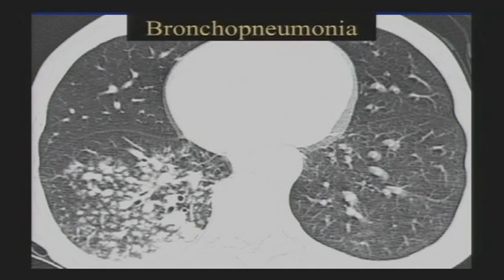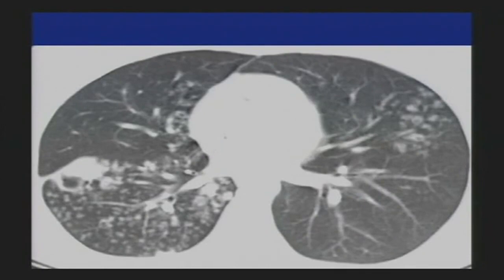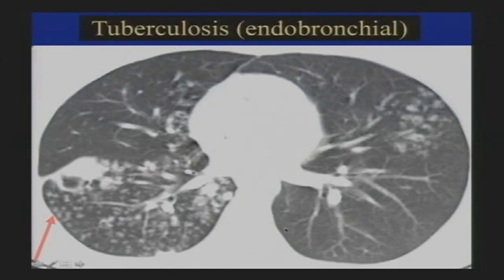Okay, another example. A nice example of central lobular nodules. See how they spare the subpleural surfaces? Eventually, when these nodules get big, they're going to touch the pleura, but the centers of them are always away from the pleura. You can see this is another area where they touch the pleura just because it's so confluent, but the centers of the nodules are always away from that. You see some in the left lung as well, but look, soft tissue attenuation looks very patchy and heterogeneous. We're going to think endobronchial spread of infection, aspiration, or tumor if the patient has chronic symptoms. That was tuberculosis.